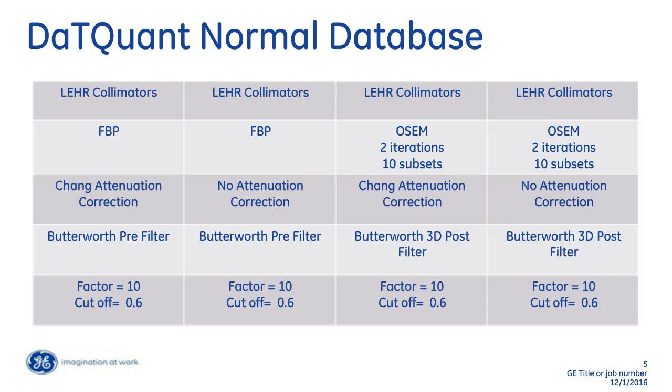Just 2 seconds. So you should be seeing my Xeleris again.